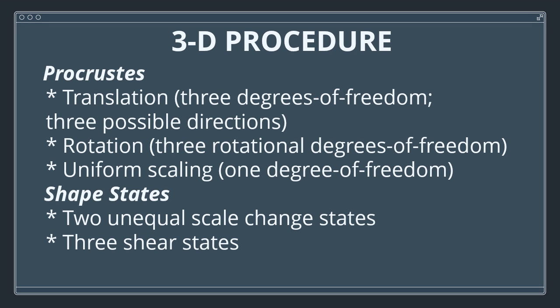If mentioning principal directions conjures up ideas about eigenvectors of an inertia matrix, that's close, but there's a little more to it. We use singular value decomposition. Again, that's just for those who want to know. If not, that's no problem. The program takes care of it.